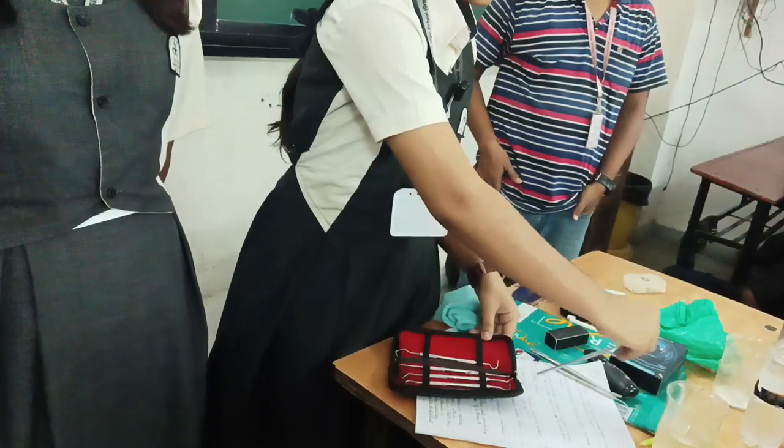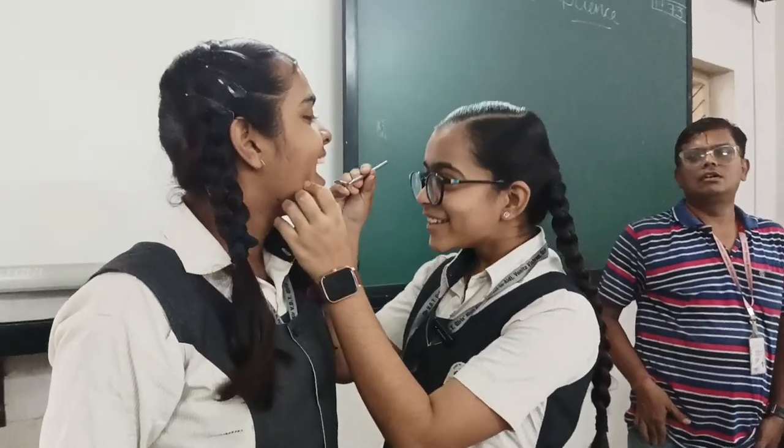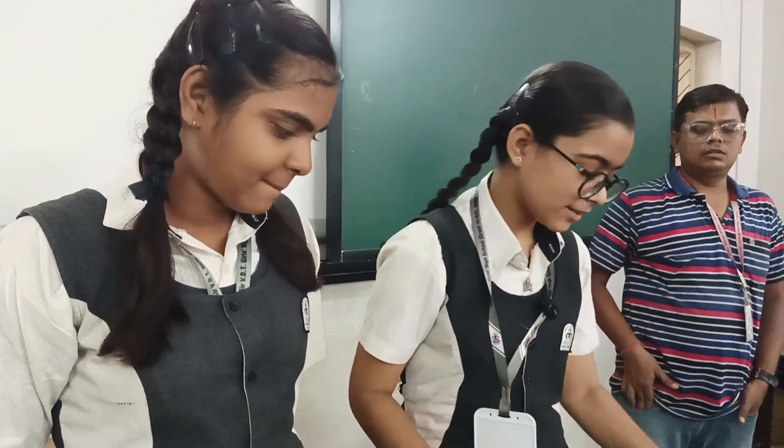Okay. This is dental mirror. This is used to see the place where we are not able to see the problems.